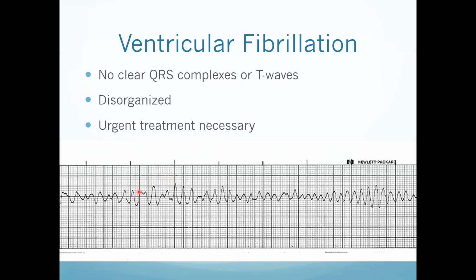So we're going to end up with ventricular fibrillation, where now we've kind of lost all the pattern. It's very disorganized. Okay, the complexes are all different sizes. It's just all over the show. And this is where we have to, obviously, start CPR and have to reach for the defibrillator. And if we don't have a defibrillator, we have to go and do a chest thump.